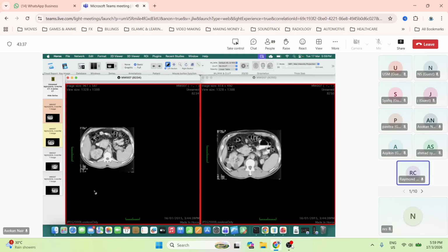Pancreas and the kidney could be associated with some kind of syndrome, von Hippel-Lindau syndrome. Yes, that's what you should say this is, okay? Because the other kidney is also not normal, right? So the other kidney is not normal. It's a systemic problem that's going on. You get a pancreatic lesion, you get kidney lesions.